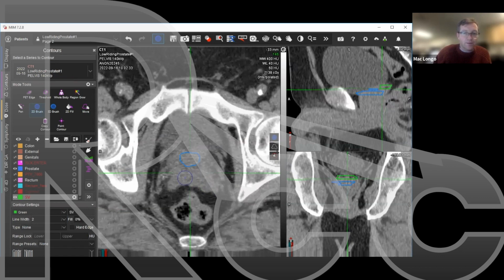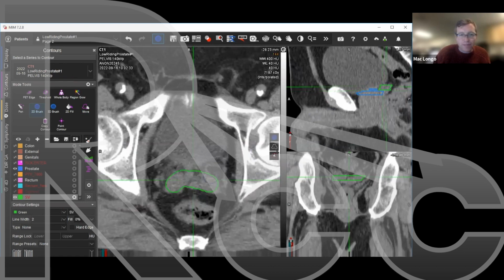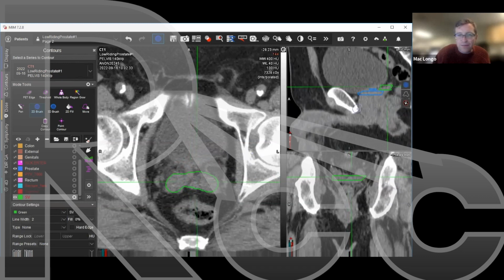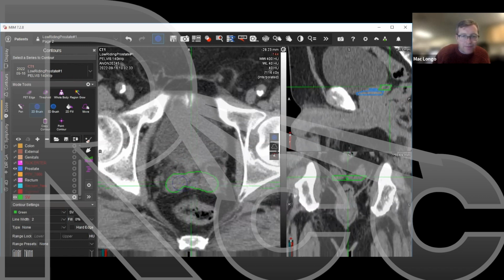Whereas in older men that have larger prostates, that hypertrophy of the transitional zone almost pushes the seminal vesicles out of the prostate, so they're really beyond that. I'm using my sagittal in addition, and I'm just seeing that things don't look as much as I'd like them to, so I'm wondering why that is. So I'm just going back and forth.